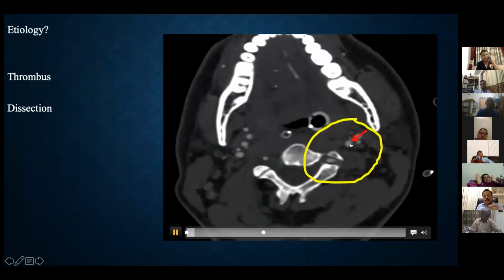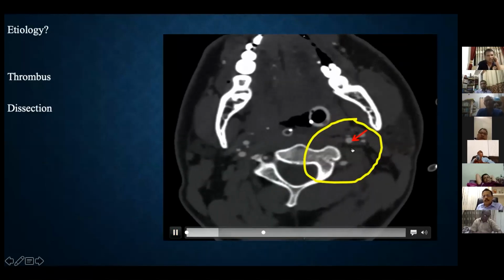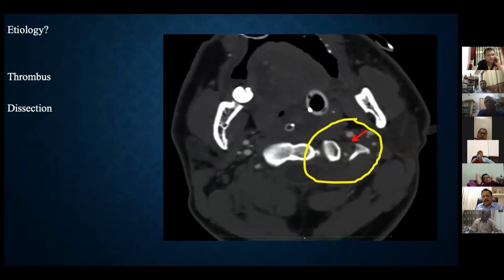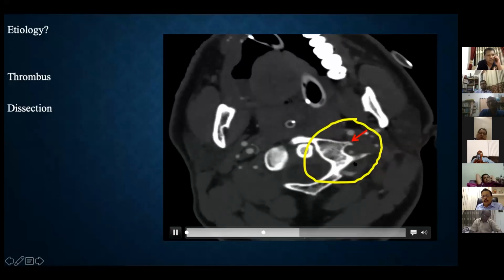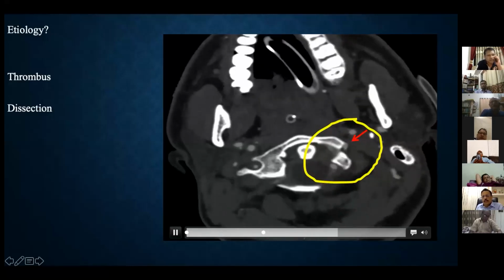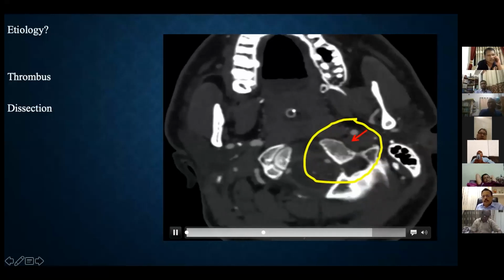So you can see this is the left vertebral artery. And again, as I said, we have to see base images to be very, very sure. And here you can see it is narrowed here and then becomes normal diameter in that area. So this is very typical of that area, just before it pierces the dura, the artery is dissected.